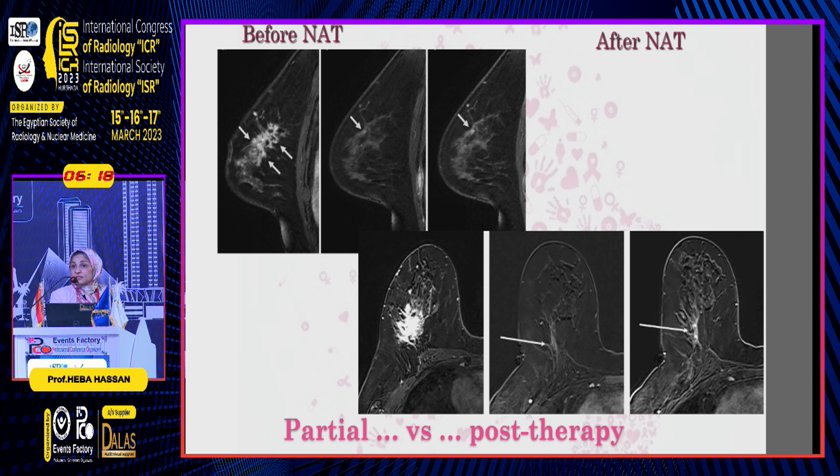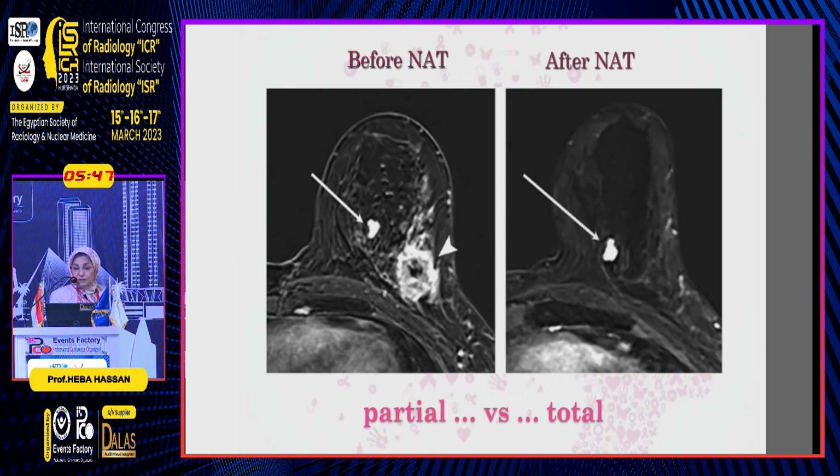This case here was HER2 enriched. On the early phase, there was no enhancement whatsoever. On the delayed, there were small enhancement foci, but because it was only on the delayed, we lean more towards it being just post therapy changes. However, we have to communicate well and still say that we do have some residual. But again, the pathology proved that yes, this was merely post-management changes, and there was complete pathological response.